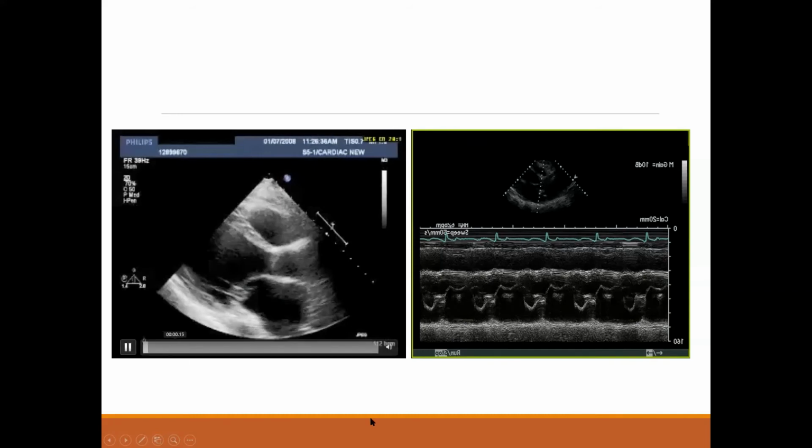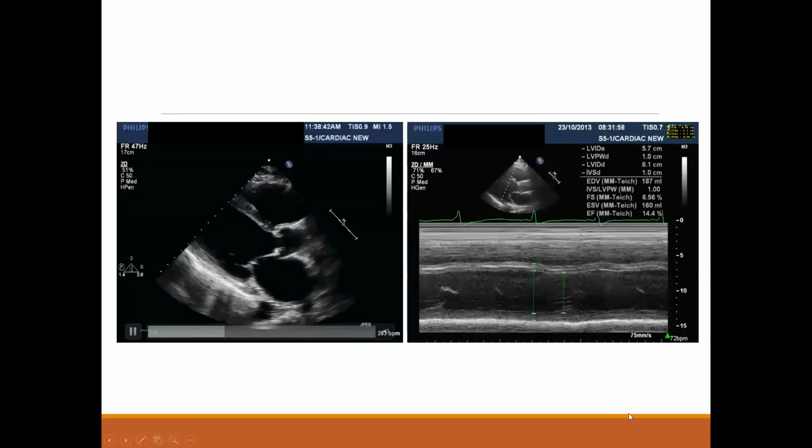Good. So that's in clinical examination. Sometimes we ask them how you correlate this echo image with the clinical exam, and you adjust your clinical exam to pick the right signs from the right site, and they get lost. So remember, sometimes we do some mix. Now, what do you see here?